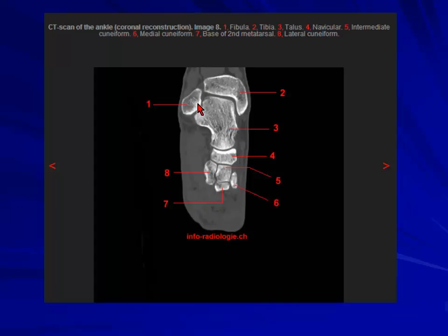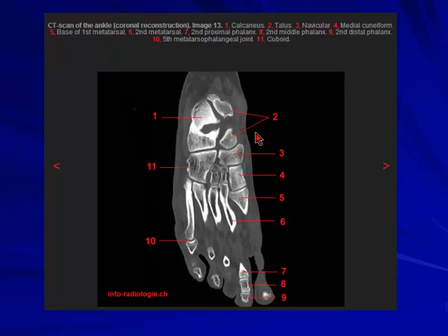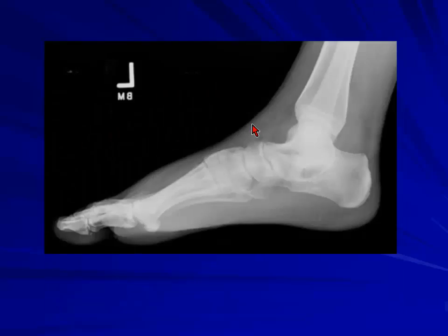So these are the lateral malleolus, medial malleolus, talus articulating with tibia, talus articulating with navicular, navicular articulating with these cuneiforms. And again, you've got the cuboid shape, so cuboid bone, flattened, navicular bone side by side, and then in between these spaces you've got medial, intermediate, and lateral cuneiform, and then metatarsals. Similar.